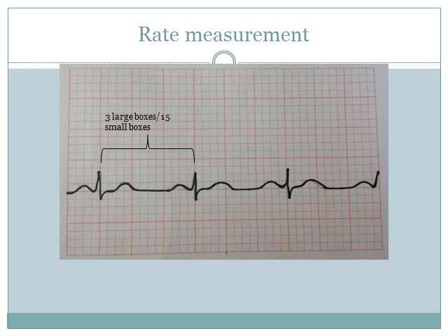Here you can see that this is a small box, but there are only 4 small boxes within this big box. But in usual clinical settings, there are 5 boxes. So just keep that in mind, and I'll tell you why. You can see between these two QRS complexes, we have 1, 2, and 3 large boxes, and I have given here 15 small boxes because of the reason I said earlier.